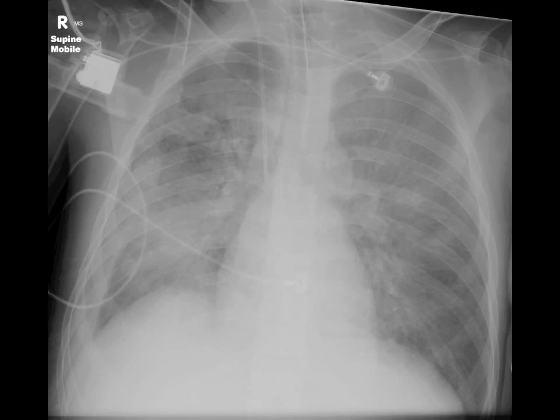In a supine film, fluid appears to spread uniformly across the film, altering the traditional appearances. For example, a pleural effusion will not collect at the bases, and upper zone pulmonary venous distension, characteristic of raised pulmonary venous pressures, will be present in everyone.